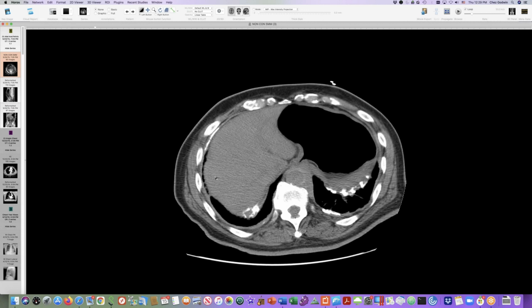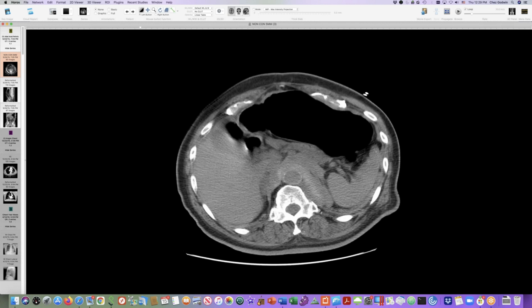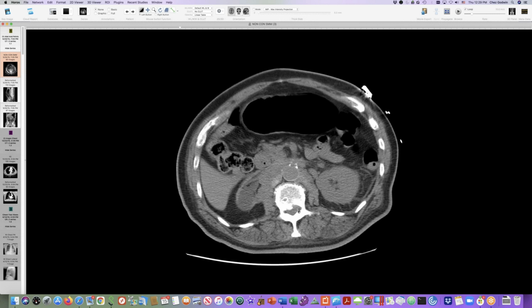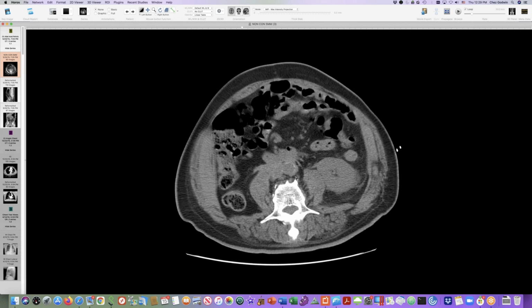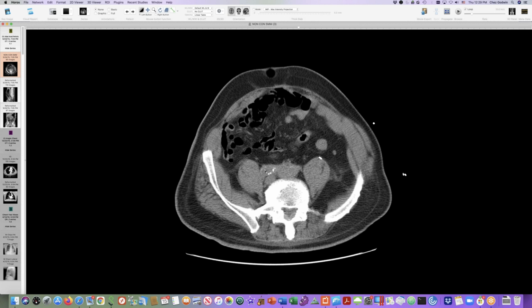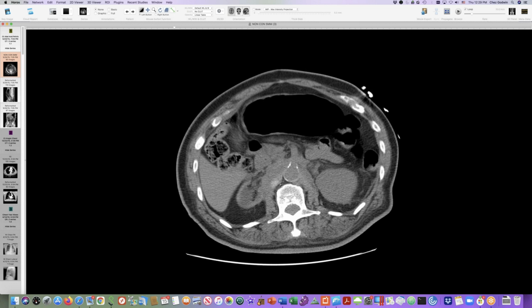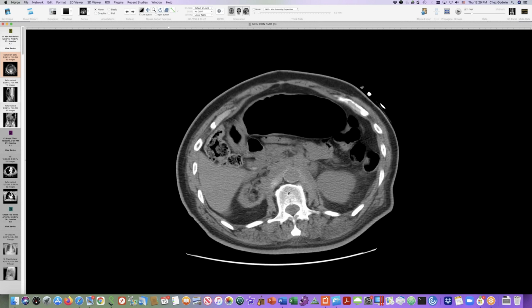So here is an abnormal chest radiograph on an elderly man who does have a history of asbestos exposure. He does have some calcification along his left hemidiaphragm that would go with calcified plaque from asbestos. He's got some blunting of costophrenic angles, which suggests something other than pleural plaque. Then he's got this big stripe along his lateral hemithorax on the left, and he's had this for a long time. The imaging I have on this guy goes back 10 or 15 years, and it's always been there.